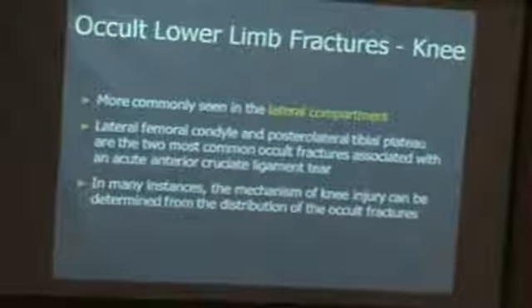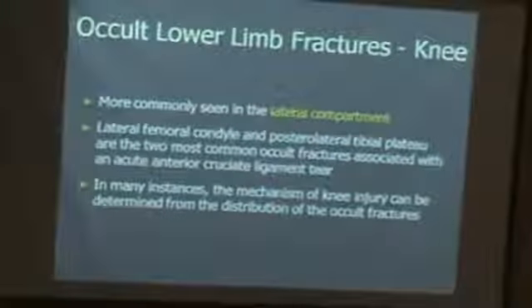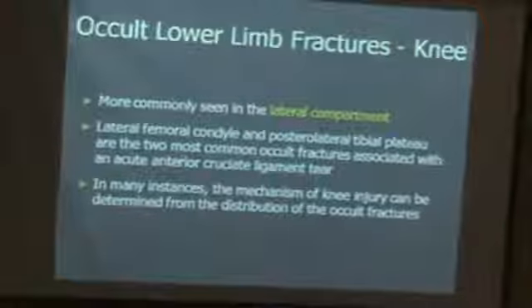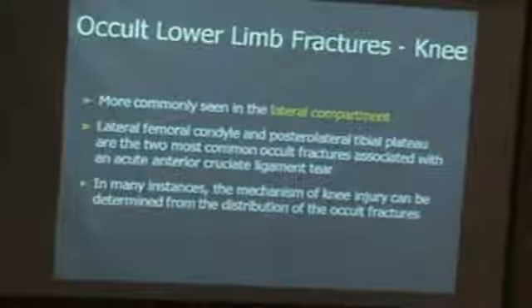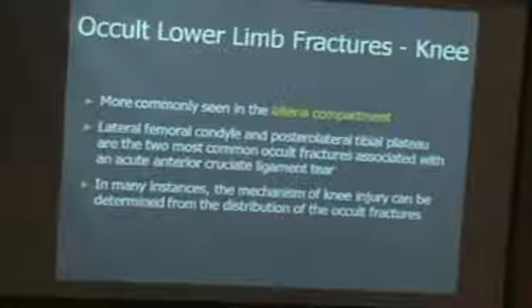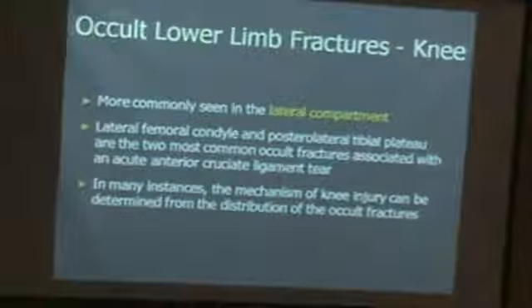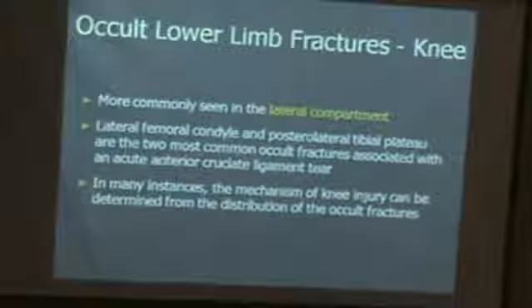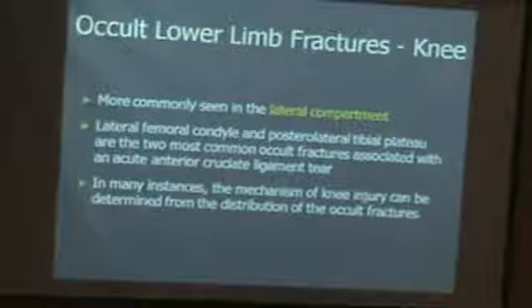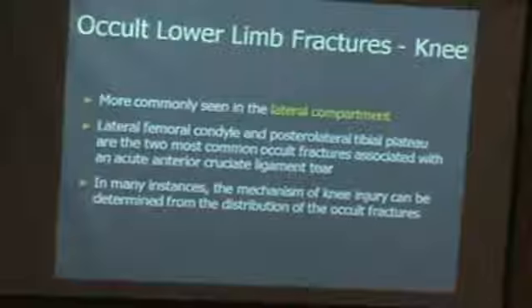And there is an article in Radiology from this year, I think February or March, by Rick Kiofsky from Wisconsin in the United States, who looked retrospectively at patients with ACL tear and how radiologists overlook fractures on the MRI. When he looked at those images retrospectively, we overlooked more than 45% of those.